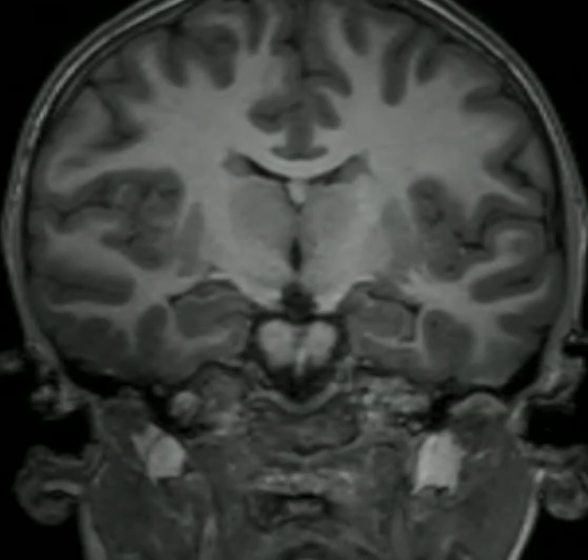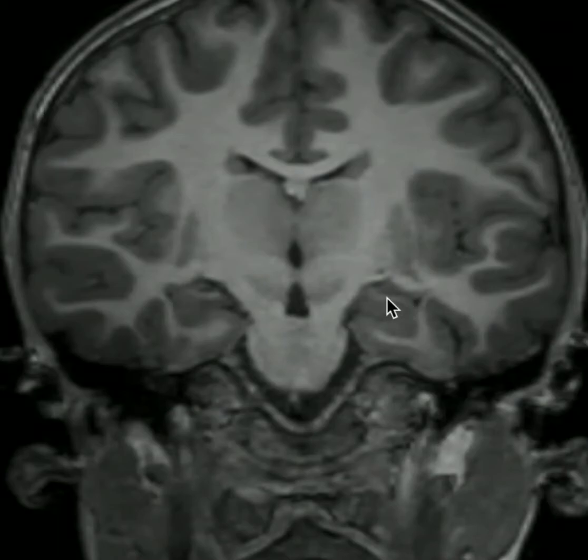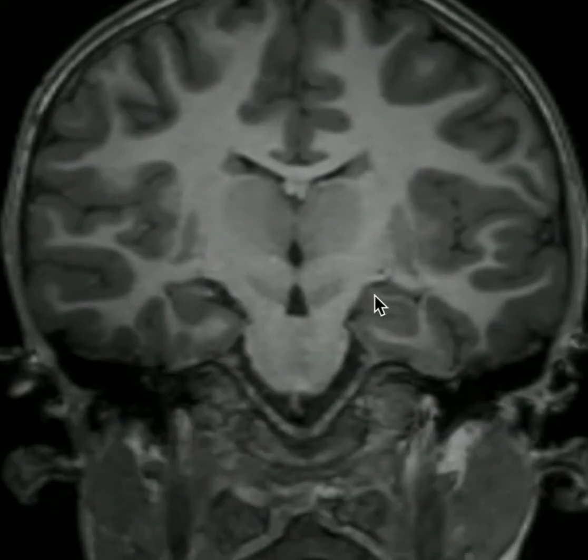Let's now talk about the white matter structures we're seeing atop the hippocampus. Right here, out laterally, we have the alveus. The alveus directs important afferent and efferent information for the hippocampus. As I scroll posteriorly, we'll notice this white matter is extending medially over here where it becomes the fimbria. I'm now at the level of the interpeduncular fossa, which is where we expect the fimbria of the hippocampus to begin. The alveus and fimbria together will feed the fornices more posteriorly.